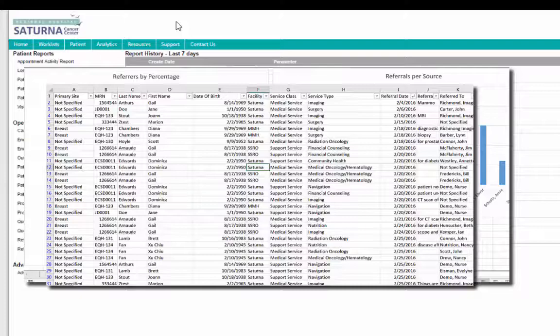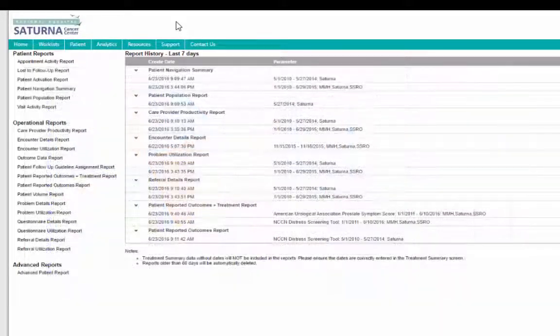The features I've talked about here are only phase 1 of our plan to help you support your lung screening program. Phase 2 is scheduled for 2017, so stay tuned.